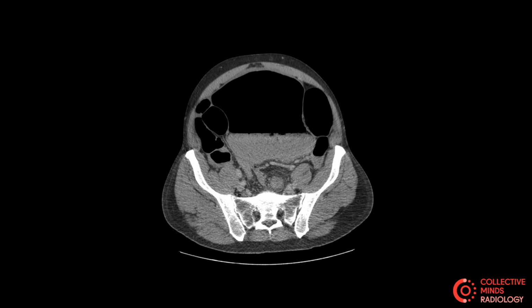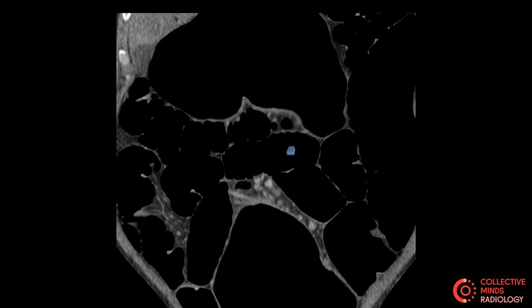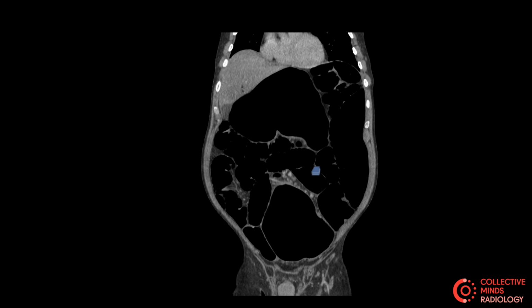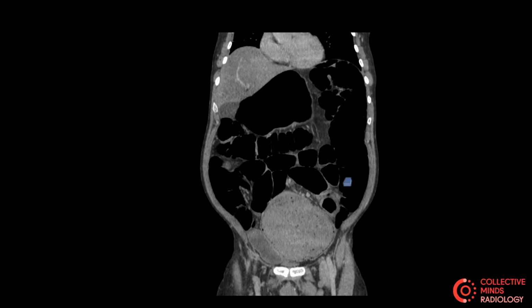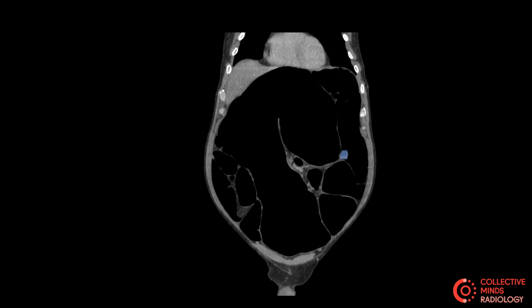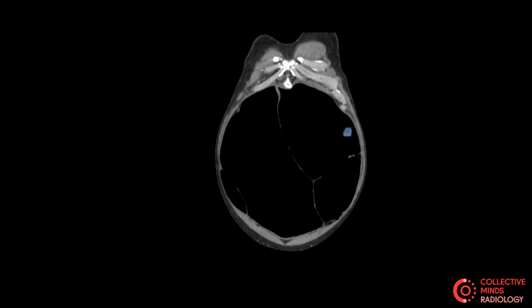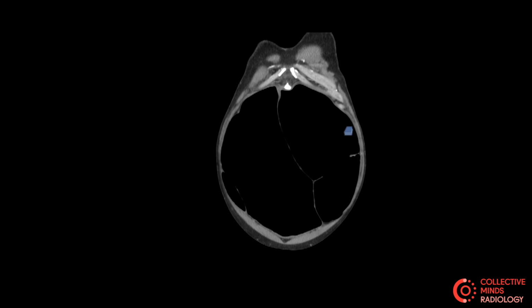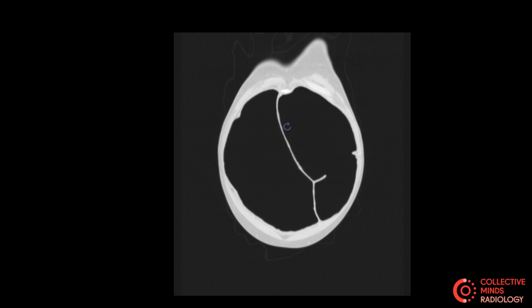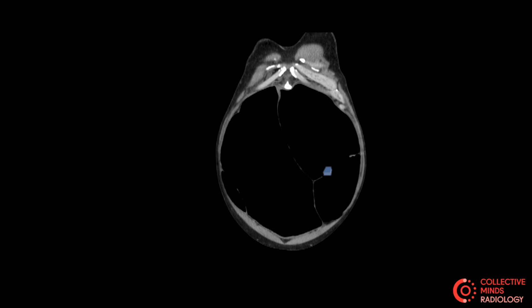So the general rule for what I would say in this particular situation is try different windows if you're not entirely sure what's happening. So let's get to the different windows and just get everything into view. So this is the not sagittal, coronal images. So let's look at the coronal images, and as you scroll through from front to back, you might get the answer when we are coming up to about this region over here. So for those of you that are quite well versed in plain films, if I go to the lung windows, it starts to look like there is a coffee bean, this is probably one of the best coffee beans you'll ever see. So this is actually looking a lot like this could be sigmoid volvulus.